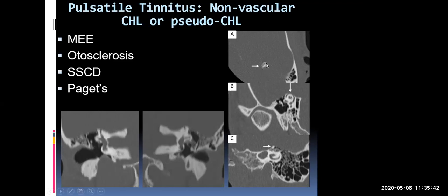This is an axial view and coronal and sagittal view of a superior canal dehiscence patient. And you can see it's important to look at all three because it's really nice to see that thin bone or lack of bone on a coronal, which you may not always see with the axial and sagittal view as well. You can see these on the coronal view as well.